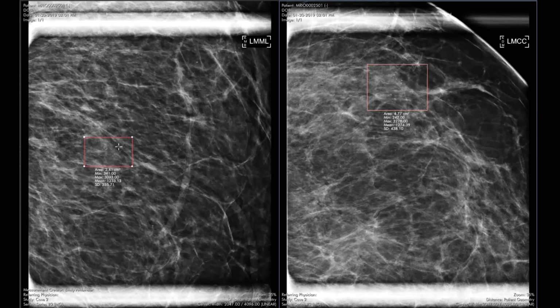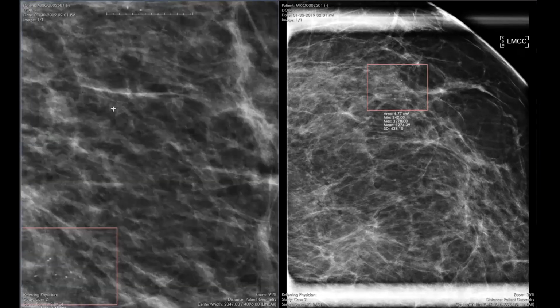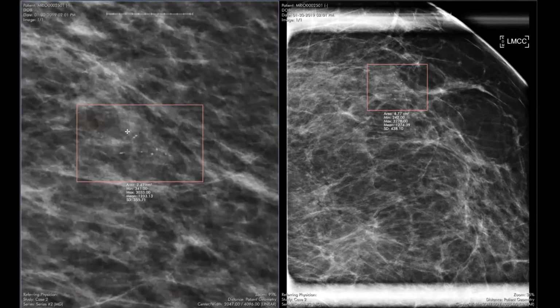When I'm looking at the calcifications, I want to, like I said, first note what the individual calcifications look like compared to the other ones. Do they all look the same or do they look different from each other? And like I said, I think these all look like little dots. So if they look different from each other, then I would be thinking about pleomorphic calcifications or heterogeneous calcifications, which are more suspicious descriptors. When they look like small dots, I can call them punctate or round calcifications.